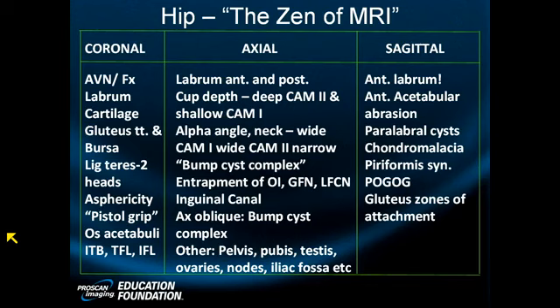I'm going to start out with my bilateral because that's what I always do. I am looking at the amount of coverage of the acetabulum on the femurs. It's a little deficient on the left side. I like to see my labrum and bone right at the femoral head-neck junction drop-off. That's why I like the bilateral. I also like to look at the angle of the acetabular roof. This one's pretty horizontal. If they slope up, I get even more worried.